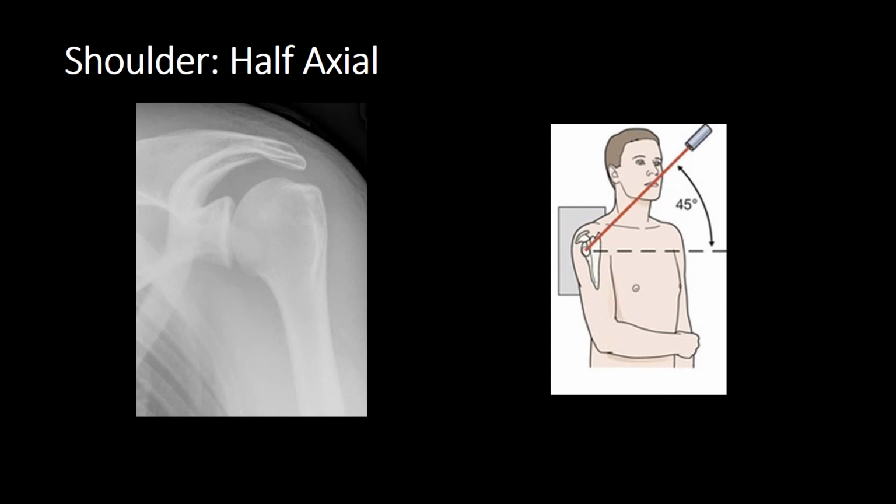So, anatomy. The clavicle is anterior, which meets with the acromioclavicular joint, and therefore this protrusion of bone is your coracoid process. As we can see, we have excellent visualization of the glenoid to assess for any fractures, and the head of humerus articulates with the glenoid.